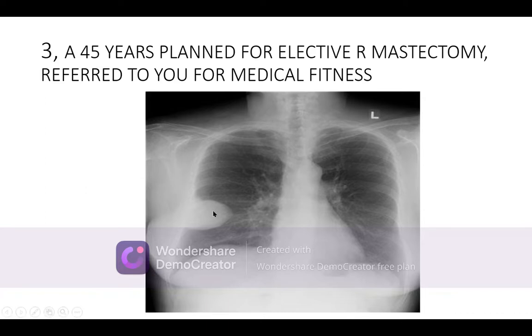As far as bronchial carcinoma is concerned, I say 4% of the cases do occur in this fashion, although not from the lateral wall, from the mid zone or the upper zone, we see in 4% of cases. Allergic conditions and autoimmune diseases least likely, sarcoidosis least likely, and parasitic invasion is possible.